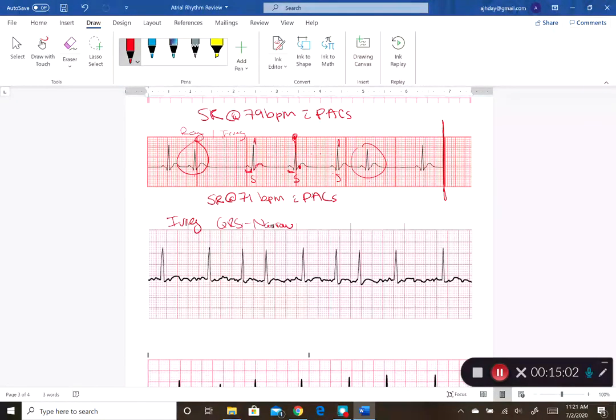So the next part I can look at to confirm this diagnosis is my P waves. And if I look between these QRS complexes, I definitely have those fib waves. So it's just random shaking going along those isoelectric lines. Now, if you look between this one and this one, your first two QRSs, a lot of people will look at this and they'll try to turn this into a flutter.